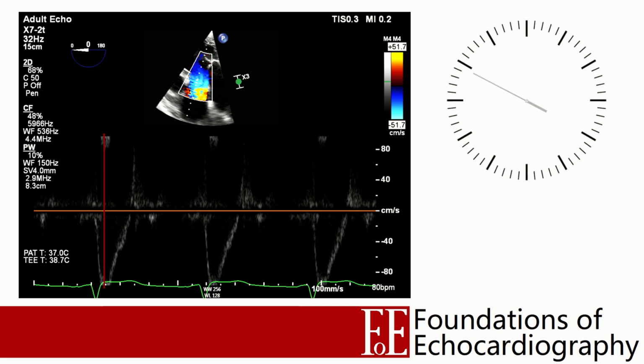By the point at which the maximum velocity is reached, the true velocity is 116 centimeters per second. This is 20 centimeters per second above our speed limit, but the ultrasound system tells us that we're seeing a velocity 20 centimeters below our speed limit, and in the opposite direction.